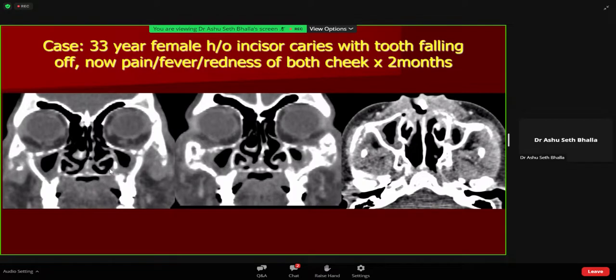And in GPA, the other causes of lesions which cause destruction like this include sarcoidosis and fungal infections. Rhinosporidiosis, rhinoscleroma, those are the things we differentiated from. What is characteristic in GPA is that the inflammation starts from the inferior turbinate and spreads laterally to involve the maxillary sinus, giving this very layered kind of appearance of the involvement of the anterior wall of the maxillary sinus, which is very typical of GPA.